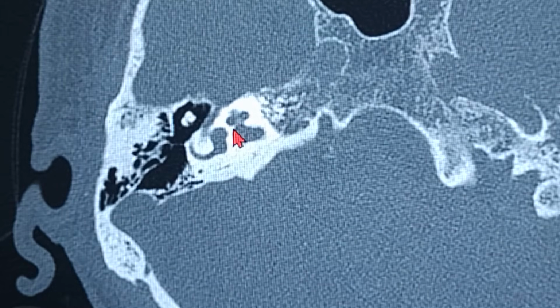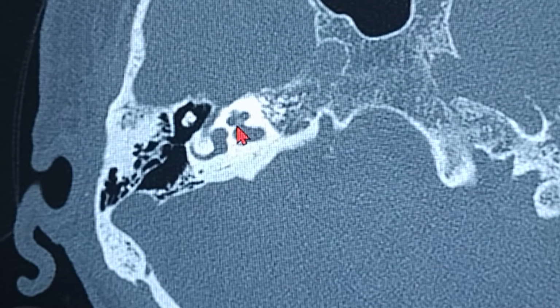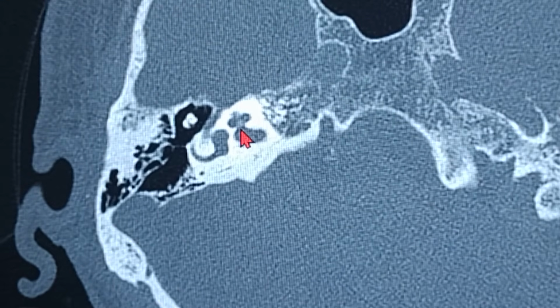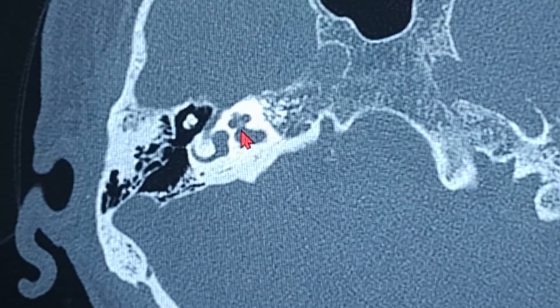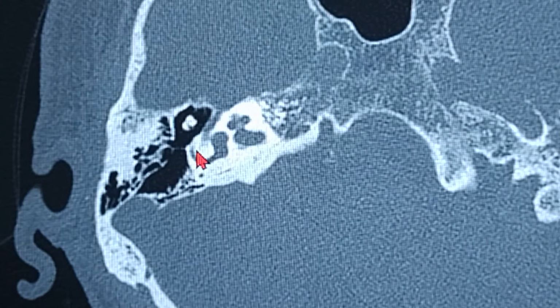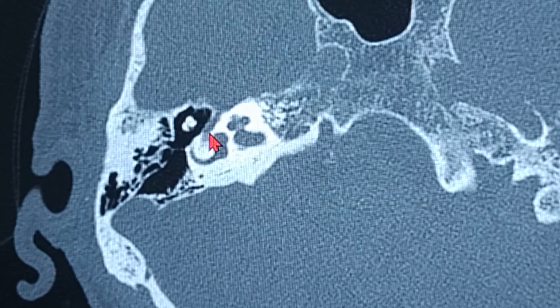So this has a huge significance in cases of cochlear implant. If the bone is not there, there is going to be a gush of CSF leak and all those complications you can see over here. That is during the cochlear implant, basically some kind of a deformity which is called, I don't know, the IP3, I guess. I'm not much into cochlear implants, but still I see the videos. You can see that's the IAC initiation over here, and that's the lateral semicircular canal. That's the facial nerve going under the lateral semicircular canal.